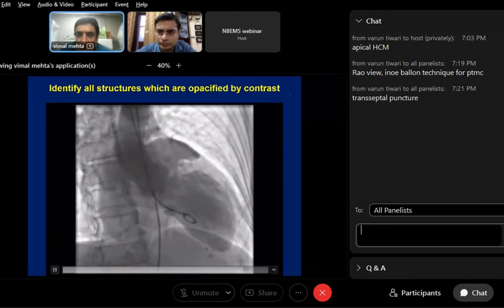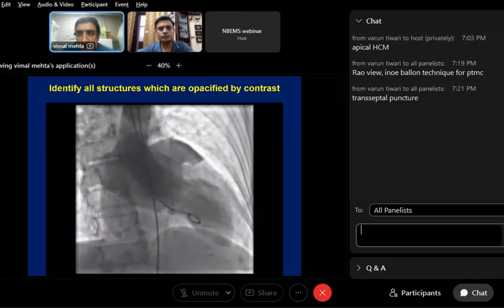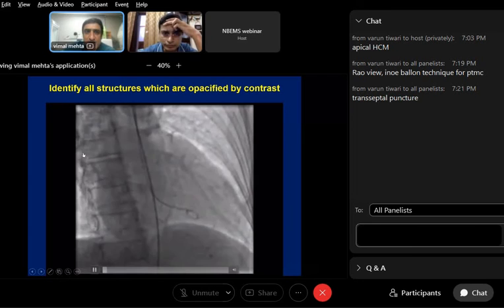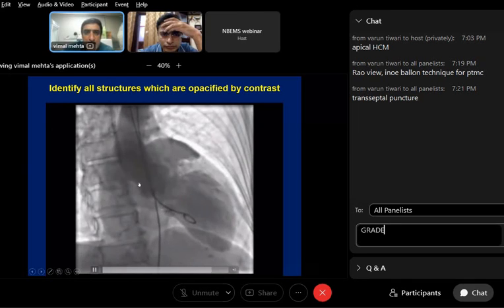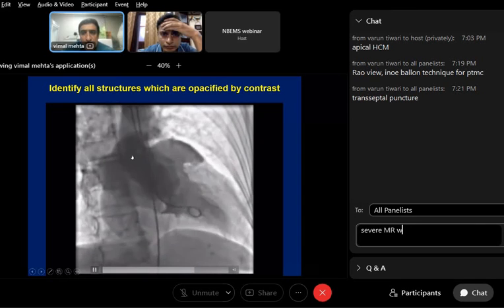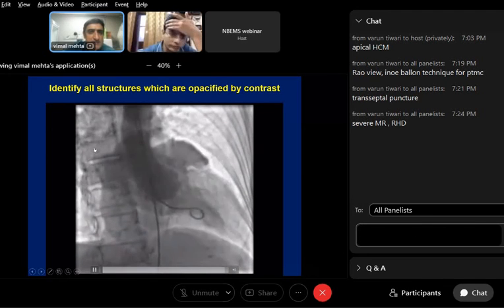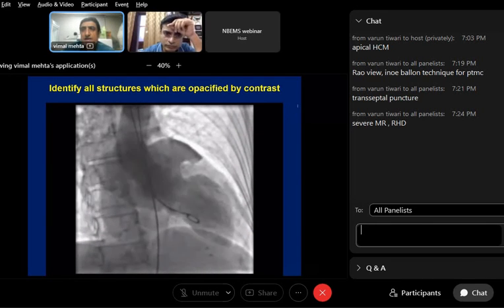Severe pulmonary vein. Okay, good. So you can see even pulmonary vein opacification. So this makes it a grade 4 MR, clear-cut grade 4 MR. See, even pulmonary veins are getting filled over here. Very good. I am impressed. Severe MR, huge LA and left atrial appendage, beautifully seen. We saw it earlier on, but here it is very nicely seen. And I'm particularly impressed by somebody saying these pulmonary veins can be seen. I mean, it's good.